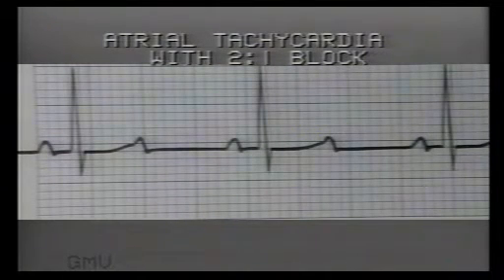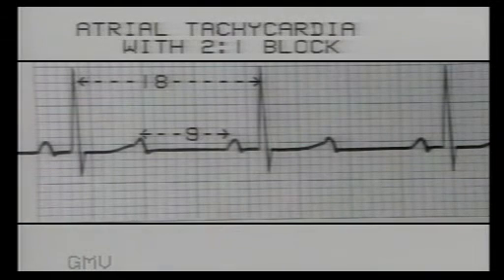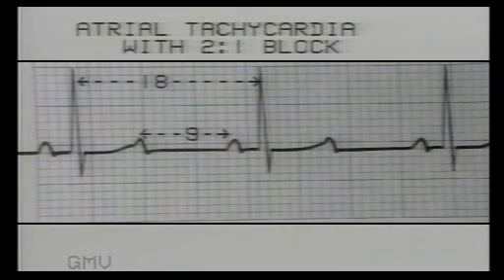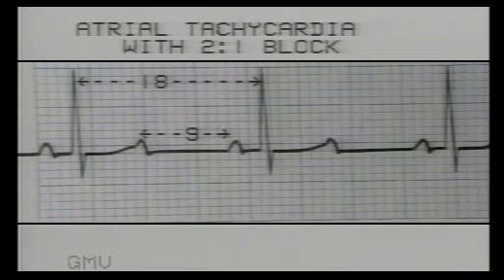In this ECG, you will immediately note that there are many more P waves than QRS complexes. Count them. Every second P wave is followed by a QRS complex. In this case, we must count the atrial rate separately as 1500 divided by the number of small squares between two P waves, and ventricular rate separately as 1500 divided by the number of small squares between two R waves.